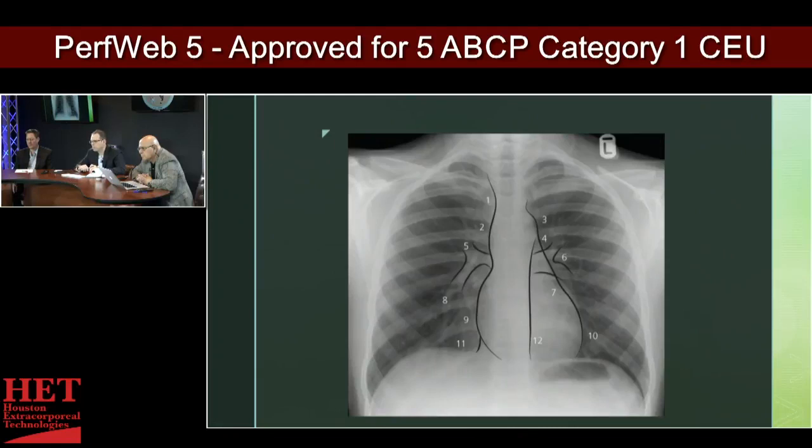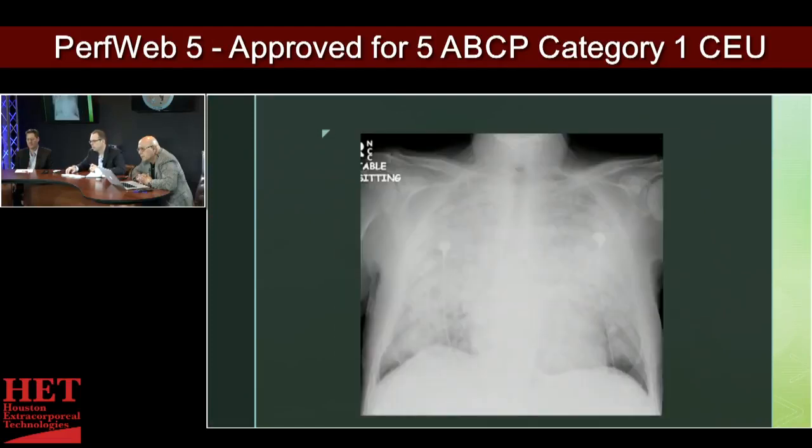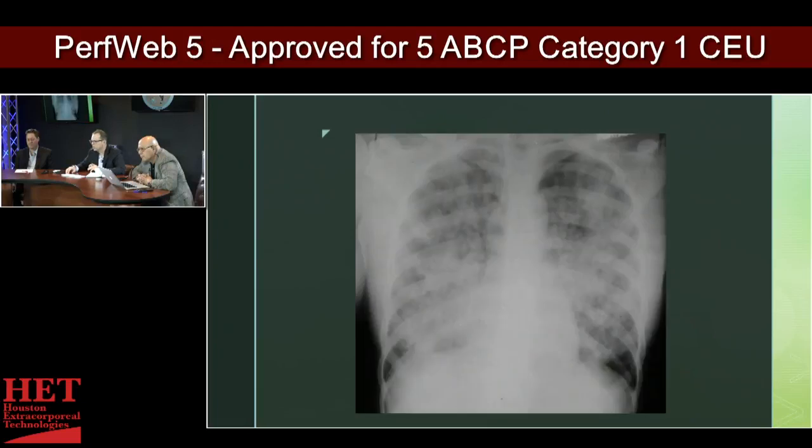you have the number 3, the arch of the aorta, and the things that come off the arch: you have your innominate, you have your carotid, and then you have your left subclavian. And so the left subclavian is going to be the last thing coming off, the thing closest to the distal aspect of the arch over on the left side. And so if you close your eyes, you could see that vessel coming off here underneath the clavicle and down to the arm. And so obviously you don't want your balloon pump inflating and deflating at the origin of that, because you can cause some ischemia.